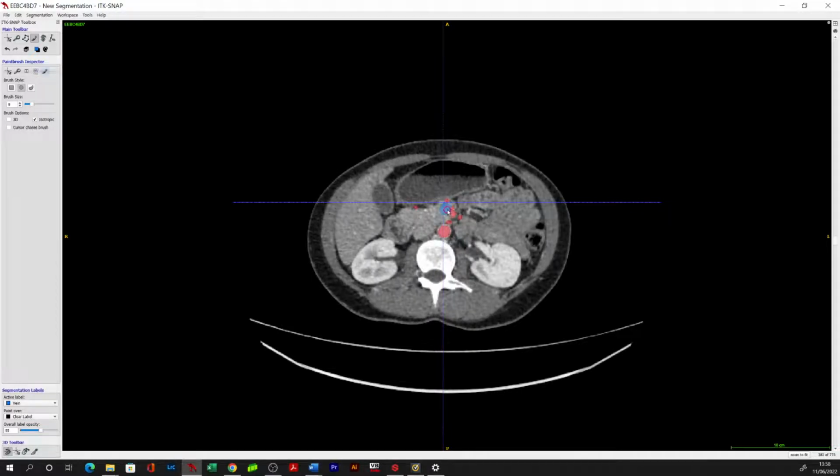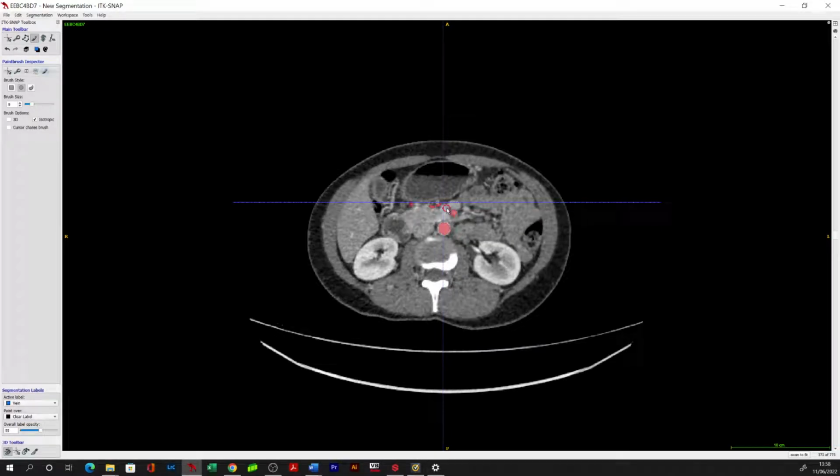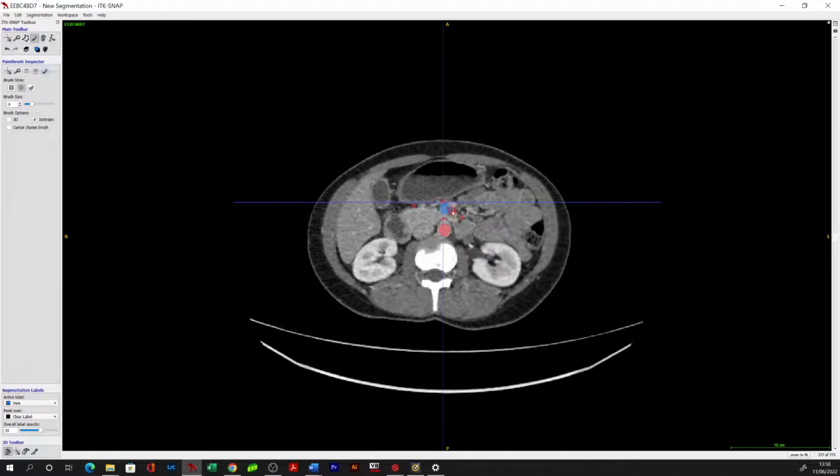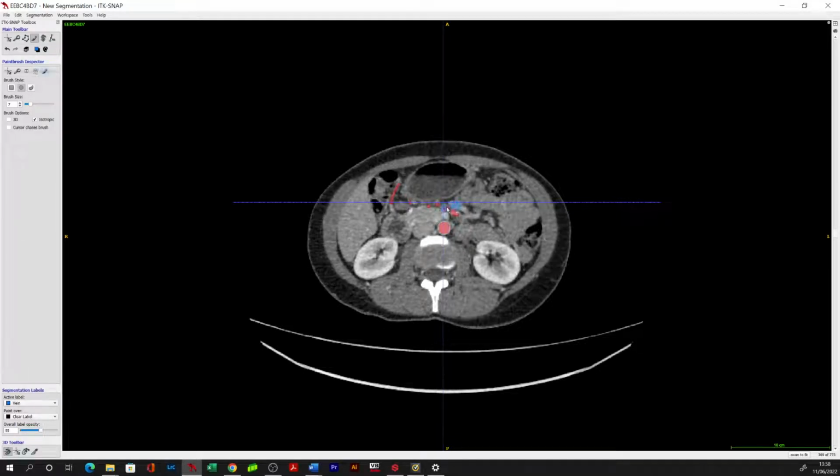And you see here we've got the MCV, which we'll deal with later. For now, let's just stick with our major thing. You'll notice here there's a vessel coming out, and this would represent what I would call the first jejunal vein, which looks like it's passing inferiorly with respect to the middle colic artery.